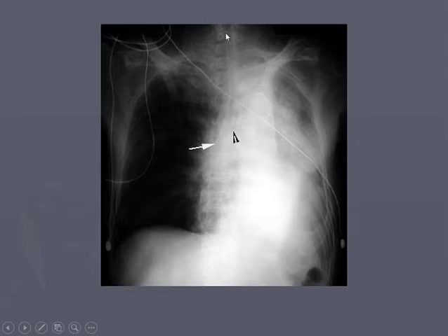This is actually pretty interesting. Airway: we can see it's kind of shifted. Where's the carina? Right here. Okay, let's look at our bones. We have our clavicular heads, they're normal. Spine's a little cattywampus, but nothing horrible. Count the ribs: 1, 2, 3, 4, 5, 6, 7, 8, 9, 10. Maybe a little hyperinflation there. You can see a costophrenic angle there. Can't see one over here on this side, or in fact it may be right up here. There's our costophrenic angle, so we can see this is much higher than over here.